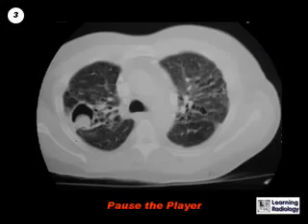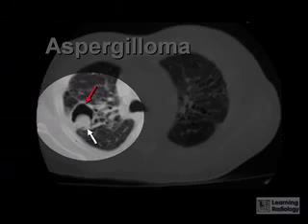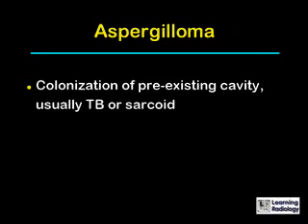Here is the next case. Pause the player. You'll notice that there is a soft tissue density denoted by the white arrow inside of a pre-existing cavity denoted by the red arrow. This is an aspergilloma inside of a previous tuberculous cavity.